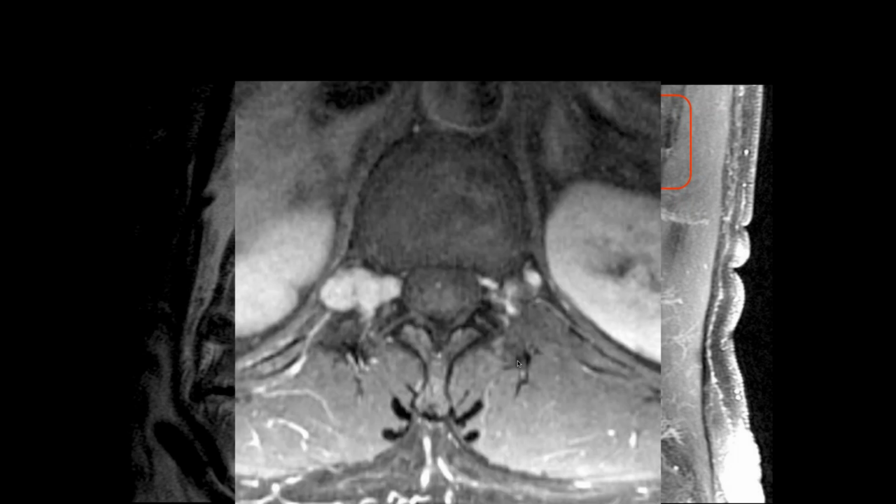Patient came in with back pain. Looks like at least one focus of, I don't know if that's a nerve root superiorly. Yeah. Thickened and with increased signal. So what would you want to look at? Well, I'm wondering if that's fluid or just nerve. Axial, right? Well, axial would be nice, sure. Okay. This is a PDFS, or is it enhanced T1? It's got to be enhanced T1 because there's no CSF. So I imagine this is enhancing. So it looks like a nerve sheath tumor.